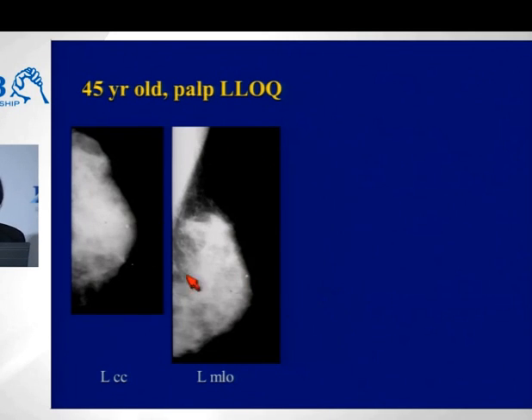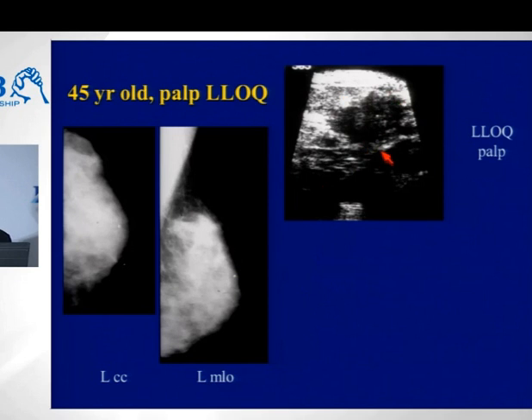And so you can tell this is a really old mammogram, but this was the very first case where I found a cancer unexpectedly on ultrasound. This was a woman who came because she had a palpable lump in her left lower outer quadrant, and there's the cancer in her left lower outer quadrant. It was palpable. They didn't have breast fellowships in those days. I'd done an ultrasound fellowship. And so, as was my habit, whenever a woman came for a breast ultrasound for whatever indication, I always scanned the rest of that breast.